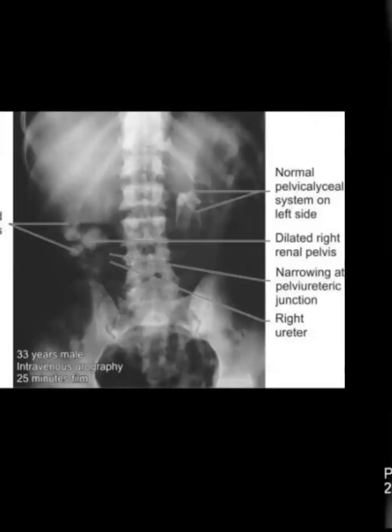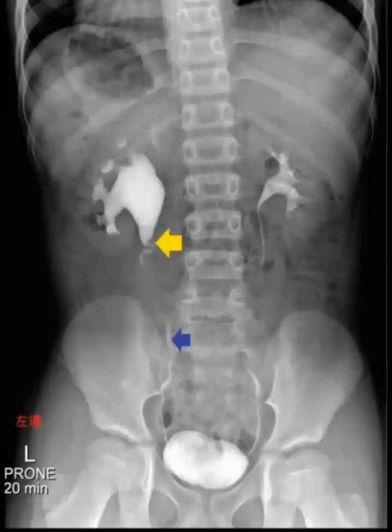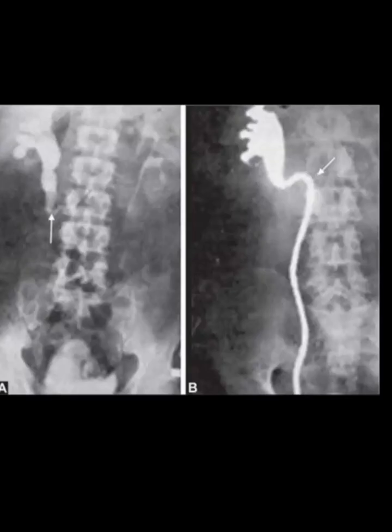So this is a case of retrocaval ureter. This ureter goes behind the inferior vena cava, at the vertebral disc level, and then it returns back. So this is known as fish hook ureter, S-shaped ureter or reversed J-shaped ureter. It leads to infection. It was published in AJKD.